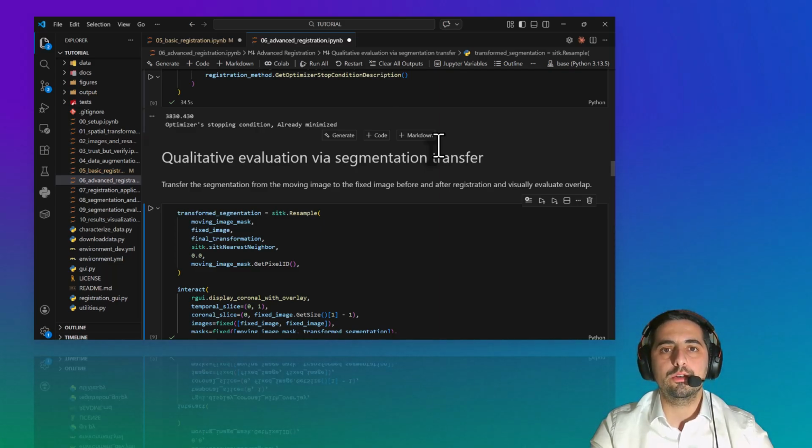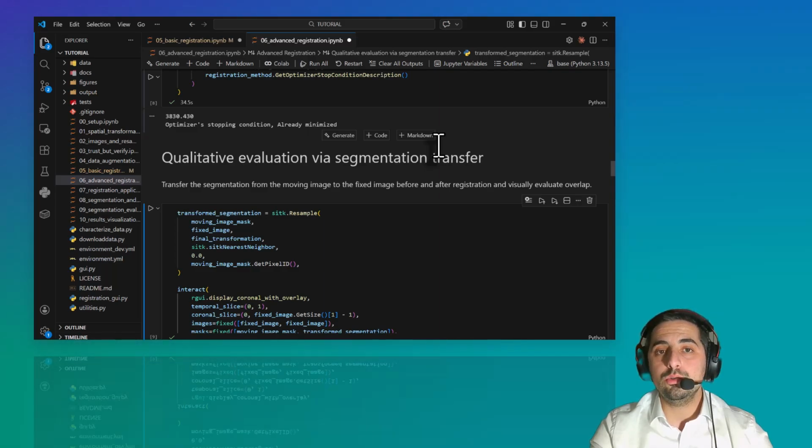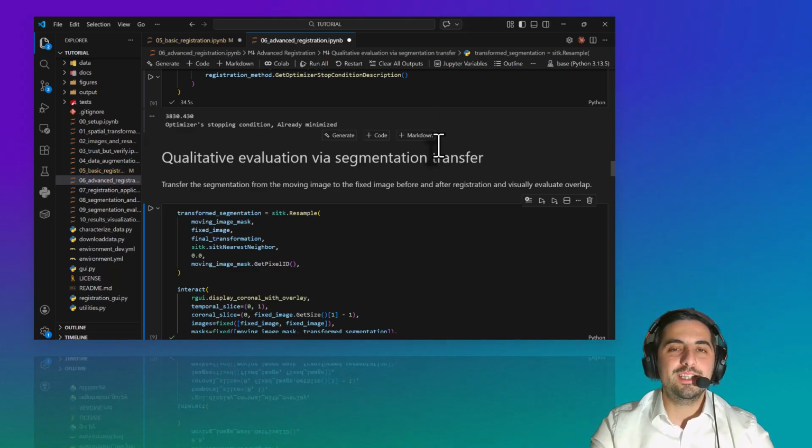But in a cube, in the volume, we need to place a grid and estimate the continuous function of the displacement field for each point of the grid, which are controlled by the control points depending on the resolution of your grid. That's it for today.